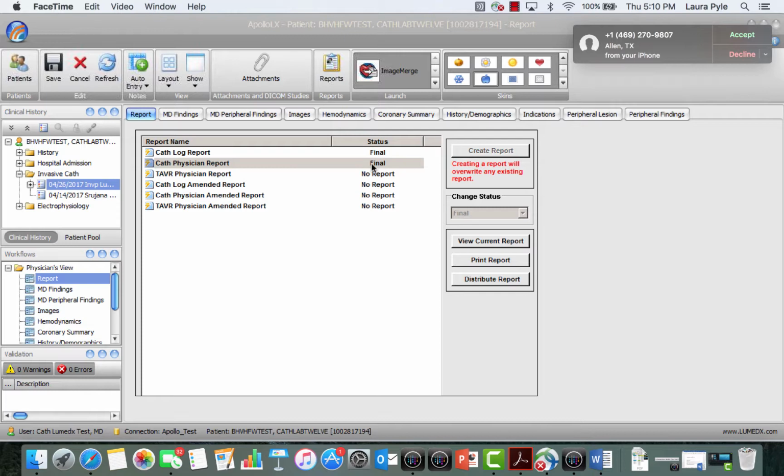Once the report is finalized, you can no longer edit the report. You will need to create an amended report. Please watch the video Lumedics Amending Physician Reports.